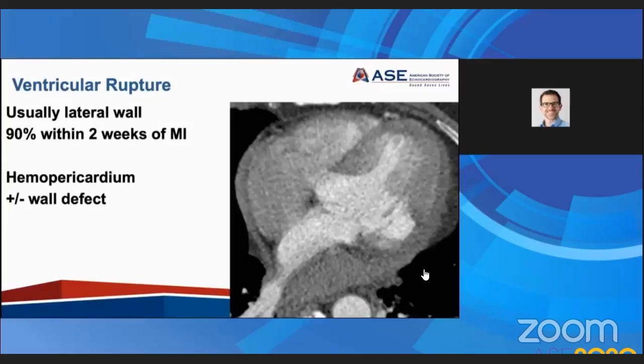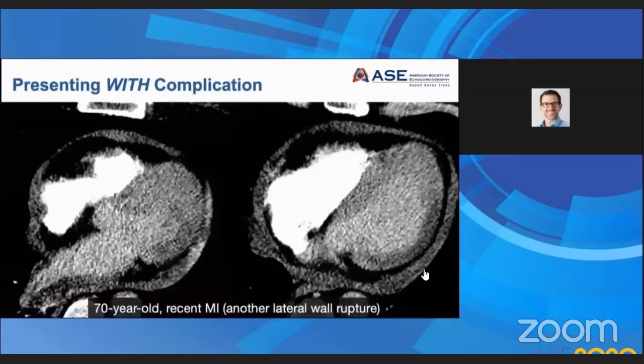But here we look for hemopericardium, and really hemopericardium is either aortic or it's from myocardial rupture in most cases, such as this case. Next. This is another one very similar. And this is a finding that most general radiologists may not make confidently, but we see this on occasion and are pretty confident in the diagnosis.